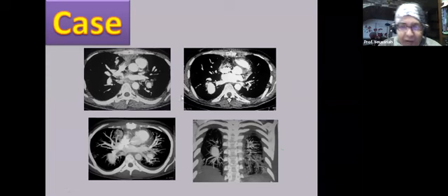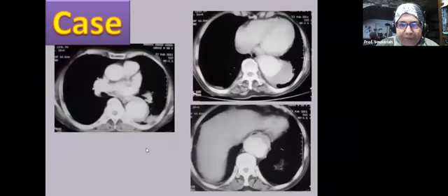So there is bilateral aneurysm of the descending branches, as you can see in the mediastinal images above and in the MIP images below. And of course, when bilateral aneurysms are found in the pulmonary arteries, you consider a case of Behçet.